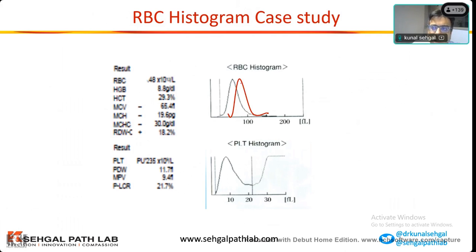Now, if you want to identify mean corpuscular volume, suppose I draw a line from this normal curve down. If this is 100 and this is 50, this line will be approximately at what, Dr. Sudeshna? Sir, approximately 80, sorry, 80. This is for the red normal curve. This would be around 80, 85 to 90. It should be normal.